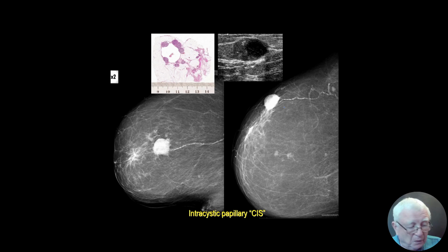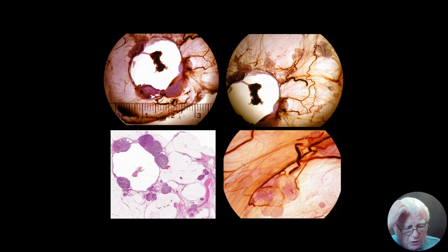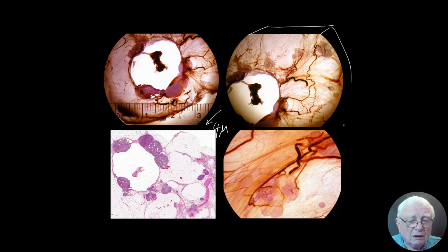And when concerning pathology, it is just admirable how much more the 3D pathology can see. Here is an elderly lady with this palpable high-density spherical lesion. When the surgeon removes it and the pathologist slices 4 micron in order to be able to see the cellular details, that's correct. But the 3D pathology is 1.5 millimeter. So you see here the intracystic papillary growth, but also the cancers here and the surrounding.